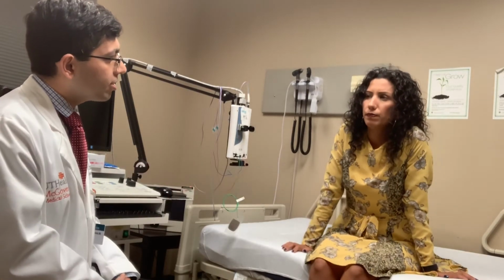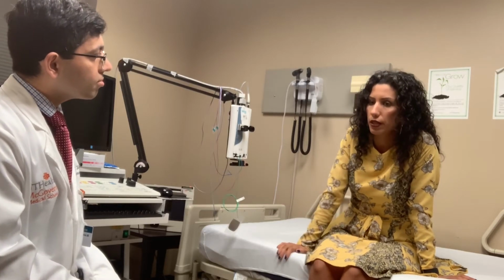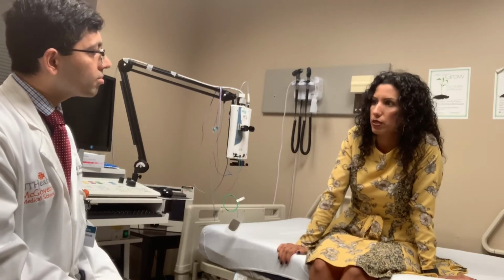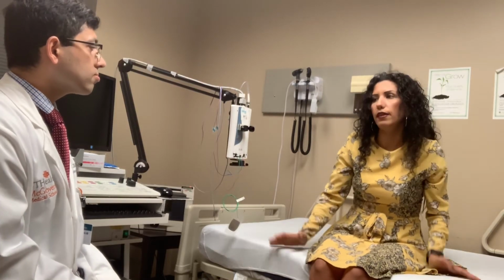Do you want to add anything, Dr. Aish? No, I think you should have a list of differentials before you proceed to the test, just like you said, so you can be focused on which nerves and which muscles you want to target. And of course, after that, like you did, explain the procedure, the risks and benefits and everything, which was a great approach.